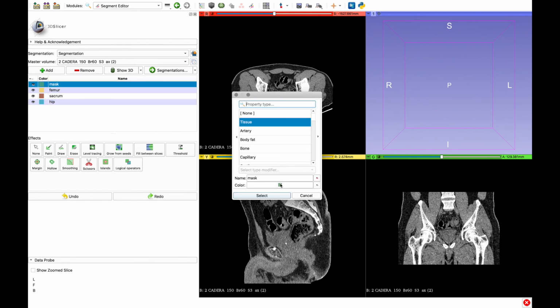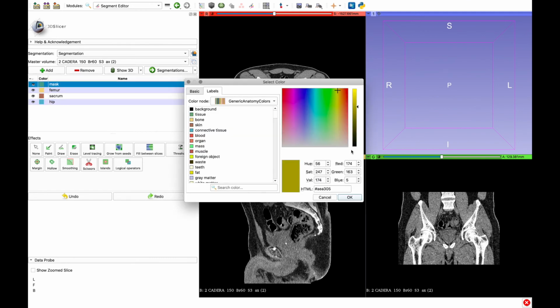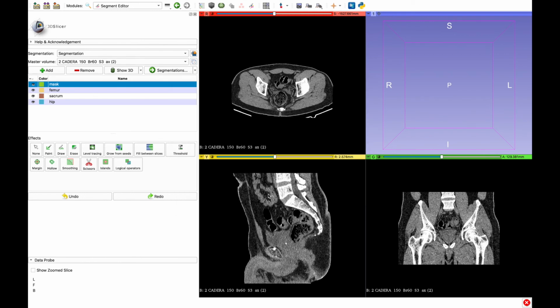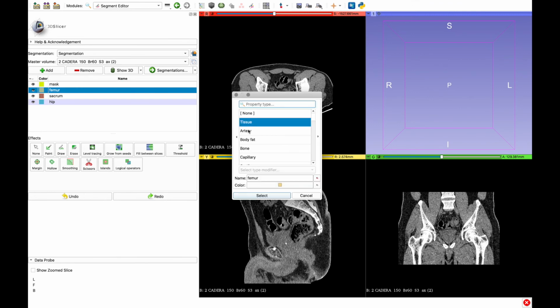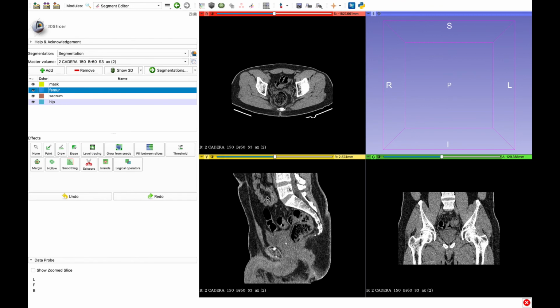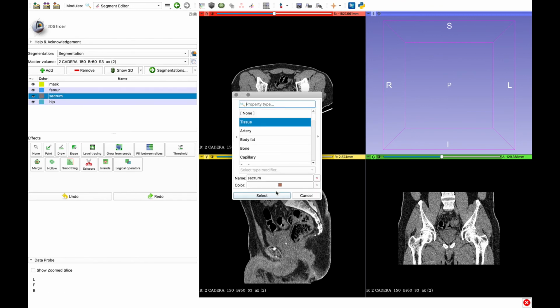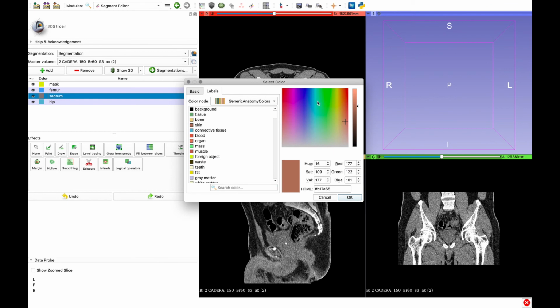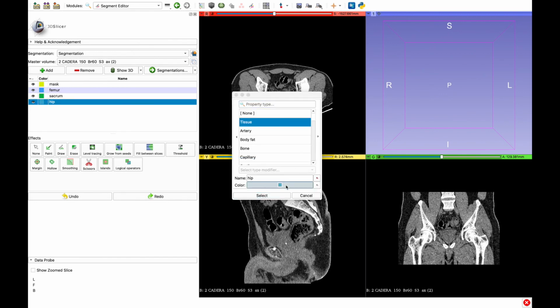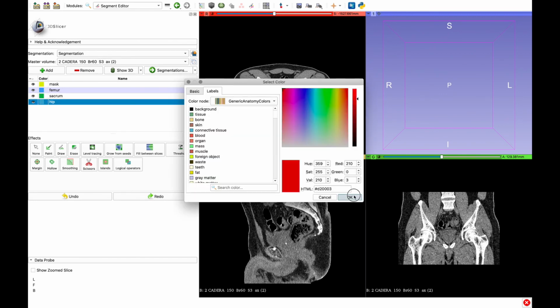Now, what I'm doing here is completely optional. I like to have higher contrasting colors, so you can click on the square and change the colors to what you want. Make this one yellow. There's some predefined colors, or you can pick on the multicolor finder. Like I said, this is completely optional. It's just a preference of mine.